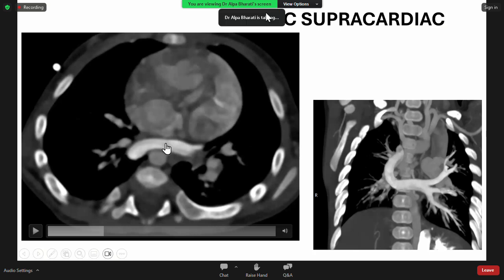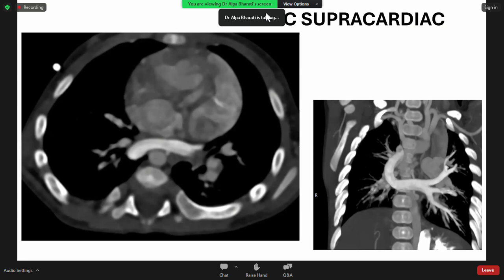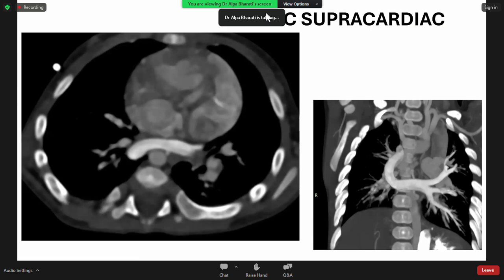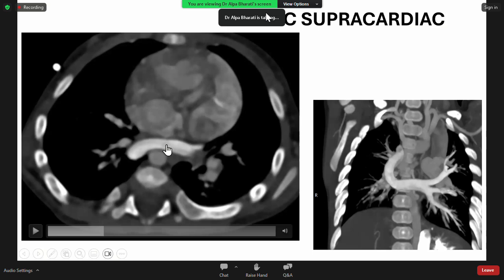So this is called a common chamber. A common chamber is a vascular channel which lies in association with the left atrium, usually the left atrium. Here it is a case of right isomerism, but it's lying posterior to this atrium. So this becomes a common chamber. This portion is not called the vertical vein. So the portion of the vascular confluence which lies posterior to the atrium is called the common chamber. This is what I want everybody to understand.